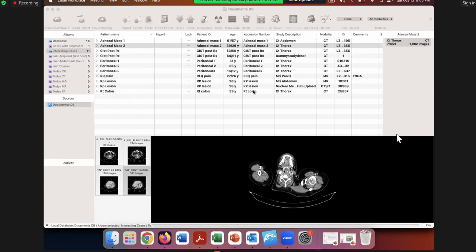So Bushra, kindly go through all 13 areas of the peritoneal cancer index. Bushra, that's crazy. Yeah, that will take a lot of time. Let's do that another time, Bushra. Okay, so Vrinda, please repeat the solid cystic part. Anything more than 80% solid component, Vrinda, is considered a solid adnexal mass.